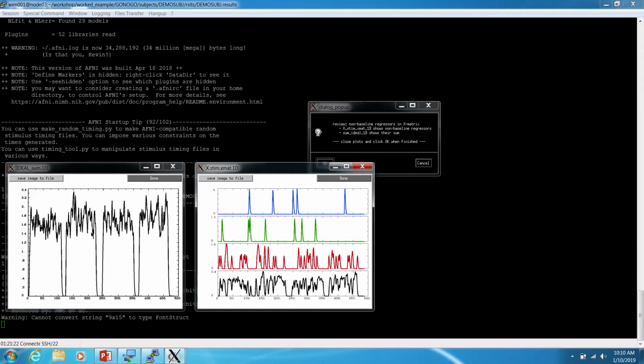And that just ensures that you're not saturating your signal. If you have way too many events too close, it just looks flat, and then you can't really delineate what was due to one event or another, because they basically turn into one flat block. So you lose a lot of information about different events. So this is a way to just see, hey, overall, did my experiment look pretty good? So that's how you can get that.